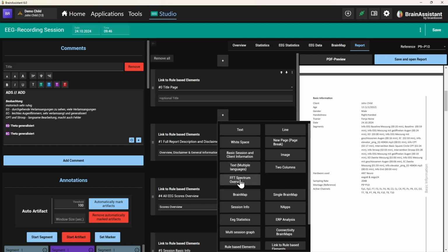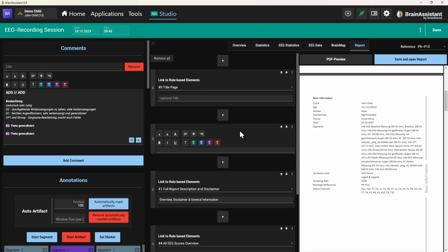So we see a lot of different things. The things at the top will be most interesting for you because there's not too much stuff you need, since with our auto report, I think we covered quite a lot of things, also complicated calculations. So what do you need? You need a title page, yes, and then we can add a text.